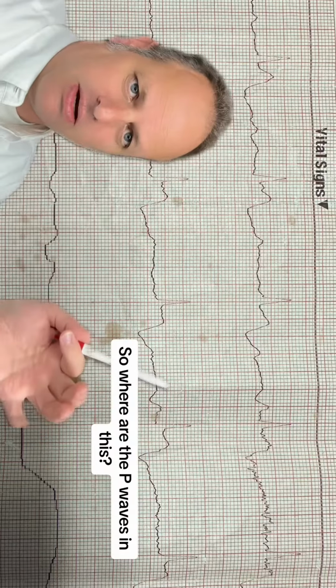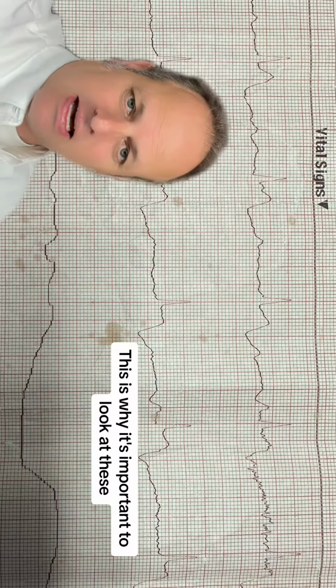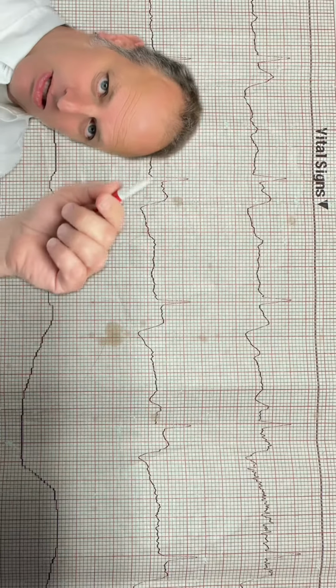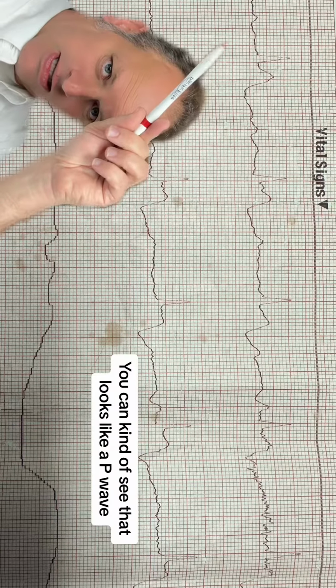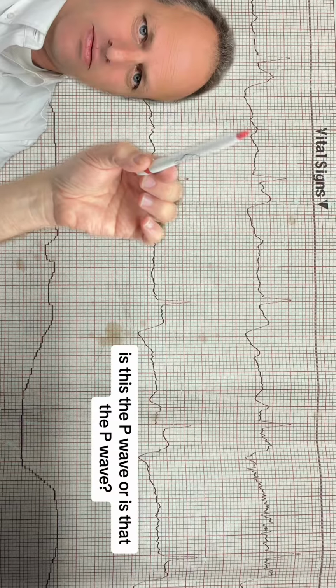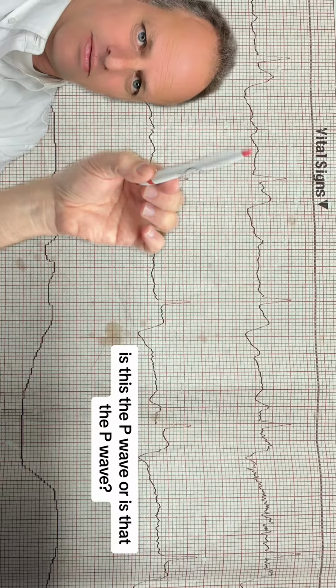Okay, so where are the P waves in this thing? This is a mess. And this is why it's important to look at these, because there's artifact. It's a good thing to practice. Take a look over here. You can kind of see that looks like a P wave. Is that the P wave or is that the P wave?